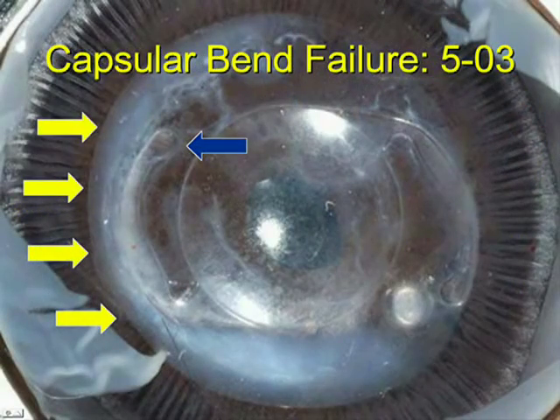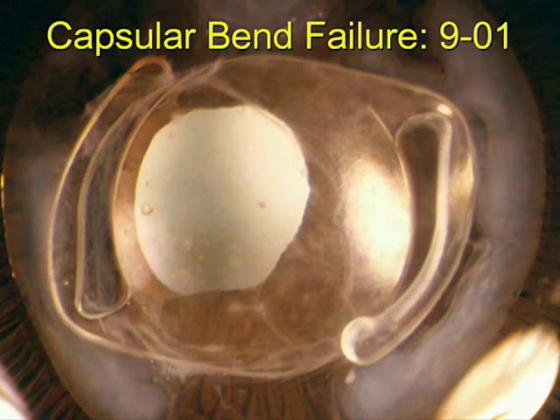More concerning, however, was what this cortex was capable of doing. Here we see at the tip of the blue arrow, the bulky haptic of the SA60 lens with no outward compressive force has been displaced out of the equator of the capsular bag by regenerating cortex. This finding thus far has been limited to rabbit eye studies. However, it has been seen at 2 separate studies at 2 separate institutions over 2 years' time.